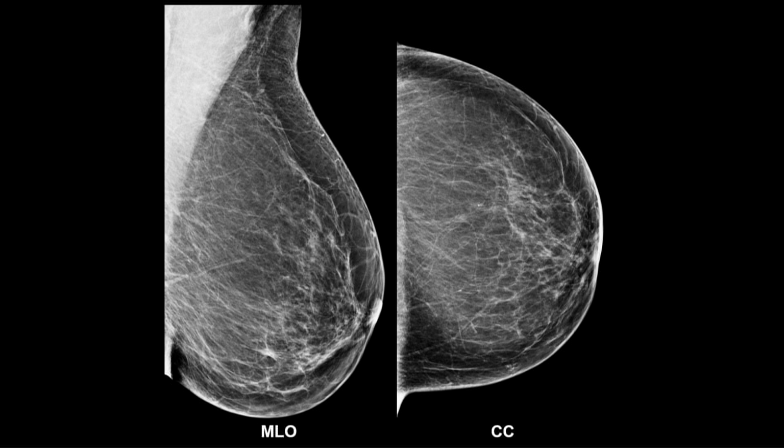Because what would cause this, if real, to be not seen on the CC view? The answer obviously is dense tissue that's bigger than that might be obscuring it. If you had a patch of dense tissue anywhere on the CC view at that expected depth, which was substantially larger than that, and it happened to overlie that finding, you could have a real finding and you wouldn't see it on the other view. So this approach doesn't work.